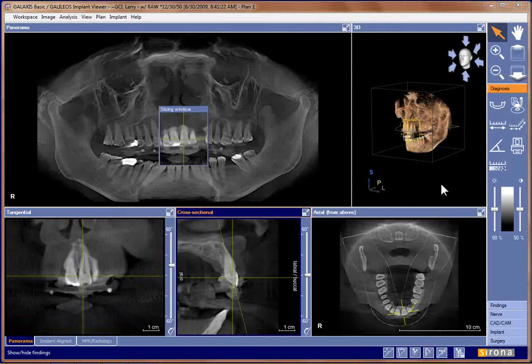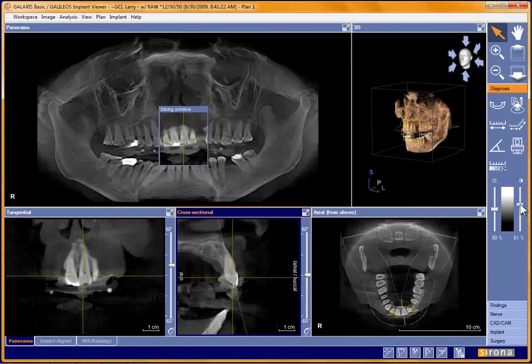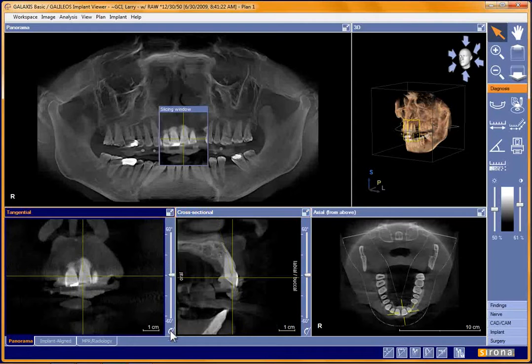If you go to the Diagnostics tab, in our tools, we have this brightness and contrast. I find that if you move your contrast up 10% or a little bit more, that sometimes it darkens your scans a little bit better for you to be able to see. Now once we've done this tilt, we can also just reset it back to the normal view.